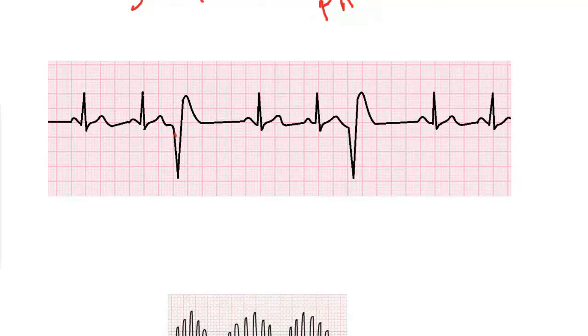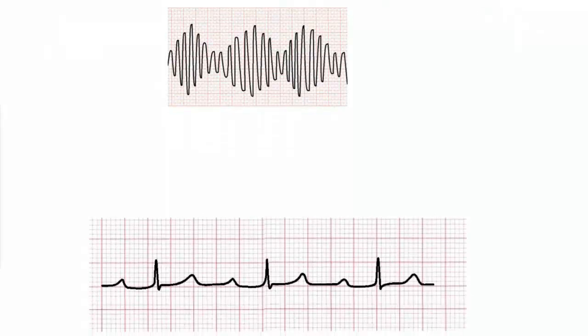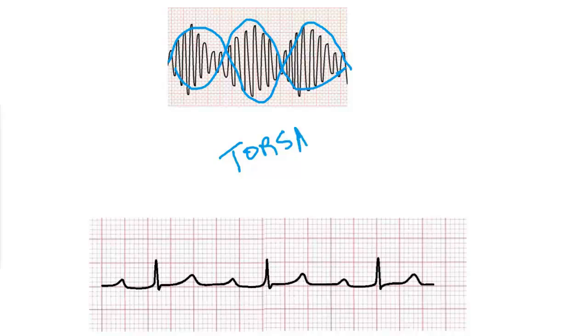Next, we have premature ventricular contraction, okay? And this condition, again, is it benign or not? So if a patient has some sort of cardiac defect, it could be dangerous, but PVC is seen in normal, healthy individuals, and it could present as a fluttering or a skipped heartbeat. What do we have next? So here you can see that the QRS is twisting around an isoelectric line. So this is an example of a torsade.